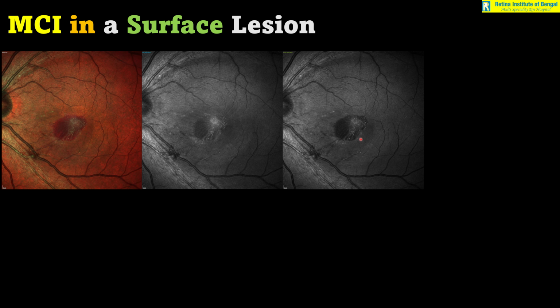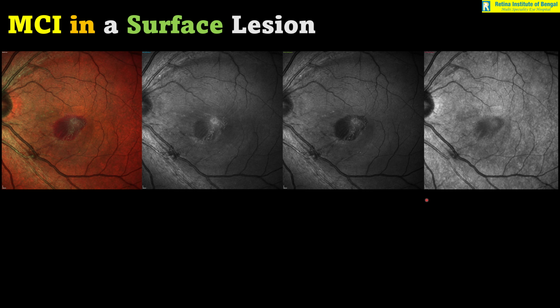In the green reflectance image, again both the ILM as well as the blood is seen very clearly. But if we look at the infrared image, here the ILM that was so prominently highlighted in the blue as well as the green is almost not seen, and only a little amount of the blood is seen, which is probably lying at the trough of the foveal concavity.